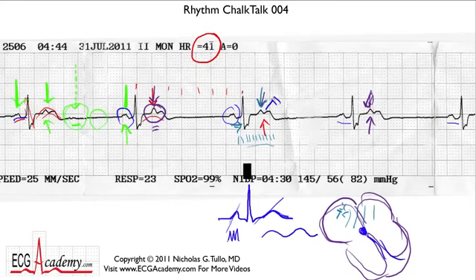and you get a P wave that blocks. Well, I don't like the word block because it implies that something is wrong, that the AV node didn't behave normally. But in fact, premature beats like this commonly don't conduct, and it's sort of normal behavior for the AV node, because the AV node, in fact, acts kind of like a safety valve, and it prevents very rapid electrical rhythms like atrial fibrillation and flutter from being conducted down to the ventricles at super high rates.